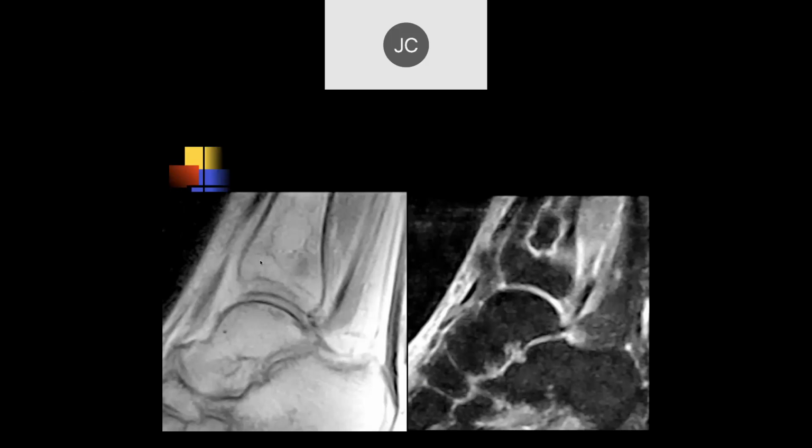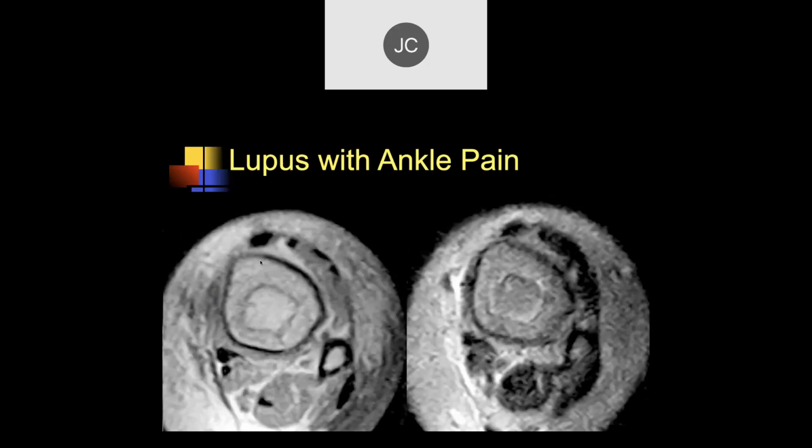The characteristic ones that I've seen most commonly that have come in as surprises are sickle cell disease, which shouldn't be that big of a surprise, and lupus. This was a patient who has lupus erythematosus and developed ankle pain due to a bone infarct. Bone infarcts are pretty common with some groups of lupus patients. Cortisone, yeah, could be if they're on a lot of cortisone.